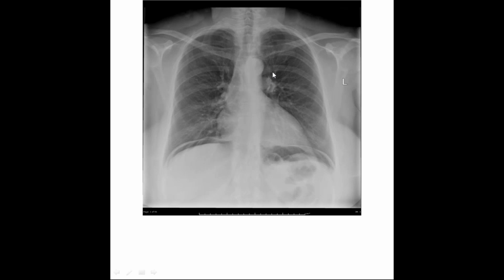Okay, now this X-ray. Here, under the diaphragm, very good. So now till now we have discussed A, B, C, D. That is what you are seeing, what the chest X-ray is done for. However, there are times when you will find, apart from the thorax, other things that can be picked up in the X-ray. This X-ray is one of the examples of that. Air under the right diaphragm, classically suggestive of perforation and pneumoperitoneum.